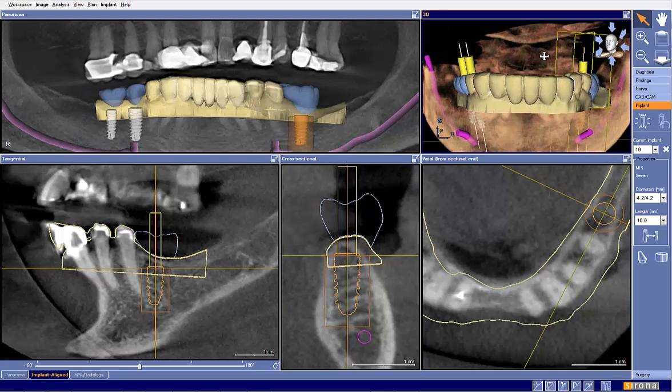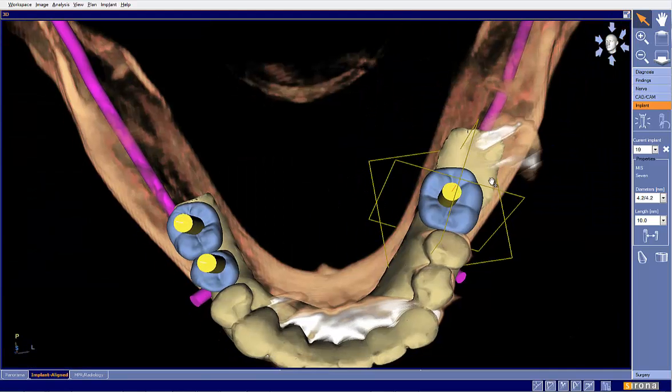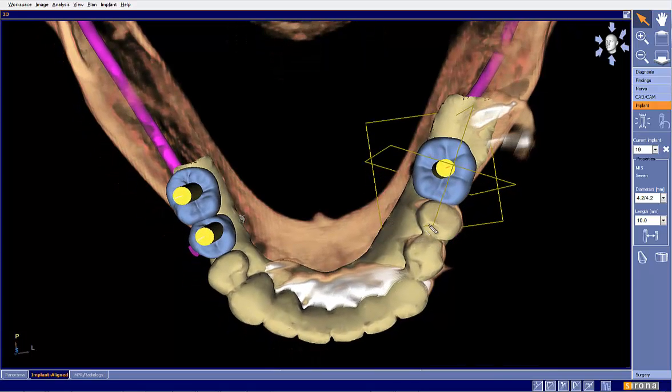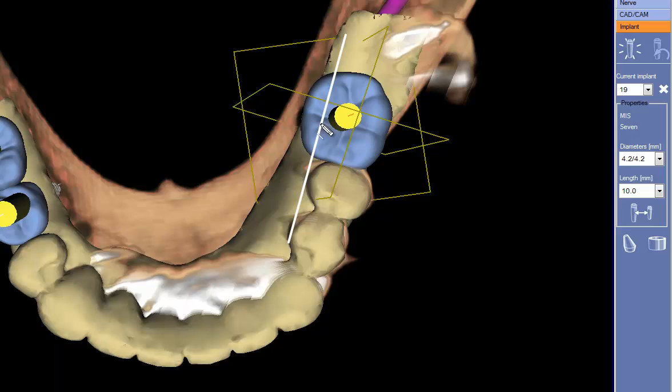And then the next thing I would look at is buccolingually. I would first say that based on what I'm seeing here, our CEREC design may not be as ideal as I would like it to be. And by that I mean if we were to draw a line along the linguals of these teeth and the buccals of these teeth, we could see that buccally we're designed pretty well, but lingually it looks like we're quite thick, and there's a good chance that if this were our final crown, our patient would quite complain about that. Now if we were to knock this portion of the crown off, we could see that our implant would actually be placed quite to the lingual of our restoration.